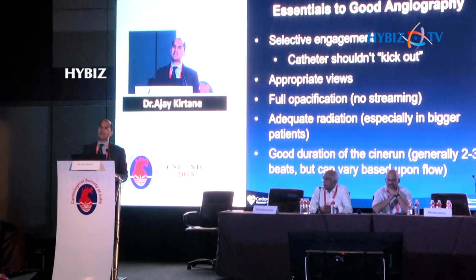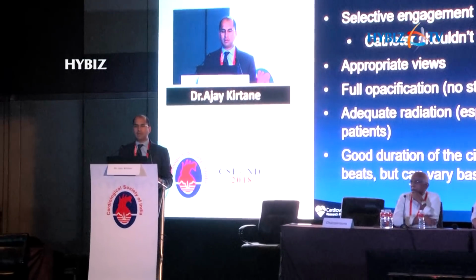And then you need to stay on long enough to be able to identify not just flow proximally and distally, but even potentially into the collateral circulation as well. So, 10 basic pearls for the new student.